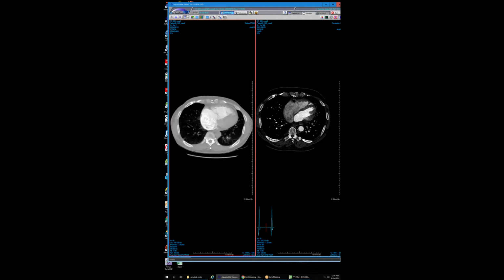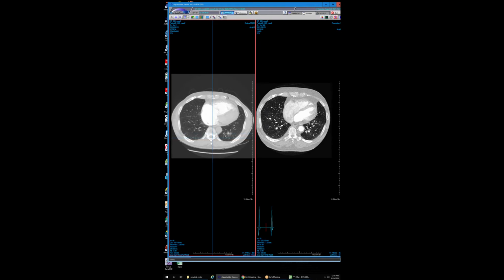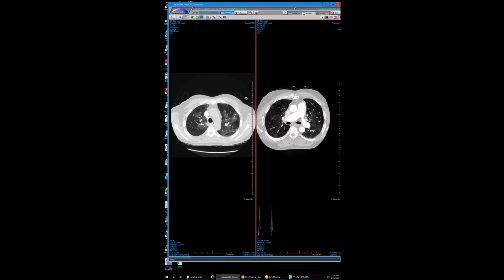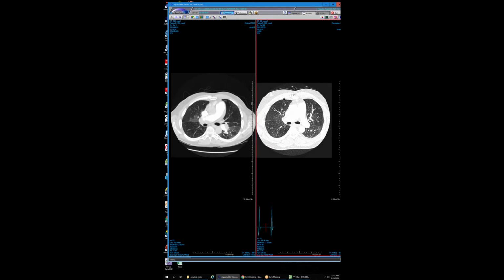But the thing that really impressed me was the improvement in the mosaicism, because that really shows that you're getting out to some of the more distal vasculature. If you look previously, you can really see how pronounced this mosaicism was. And on the current study, there's still some degree of that, but it's remarkably better. And you know that these areas of mosaicism are due to reflexive hyperperfusion of the few areas that are actually open. I just thought that was really interesting, because I've seen the heart changes before.